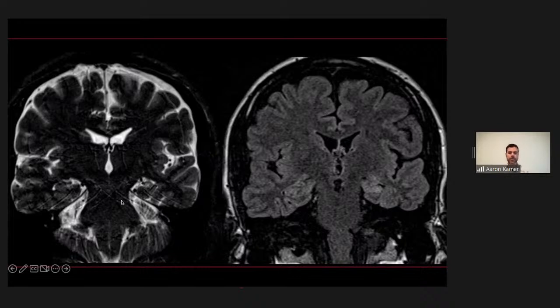Yeah, okay. So tell me about that. Yeah, so definitely on the left, right signal, loss of the normal architectural pattern there. It doesn't look like it's malrotated relative to that prior one, though.